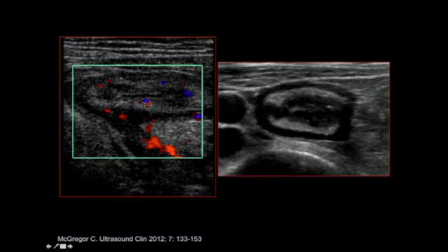Another patient with right lower quadrant pain and terminal ileal thickening, preservation of bowel wall layers, and again a hypoechoic tract with Doppler flow consistent with inflammation of the tract. These fistulous tracts can blind end in the mesentery, they can communicate with the skin, they can communicate with other loops of bowel, or they can communicate with the retroperitoneum. And when you see these tracts, the next thing you should do is rule out the presence of associated abscess, as they can lead to mesenteric abscesses.